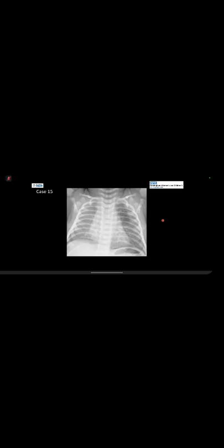Yeah, this frontal radiograph, a pediatric group patient, is a frontal chest radiograph. So there is hyperinflation over the left lung, and with hyperlucency over the left lung as well. So I think the abnormality lies in the left lung. The right lung relatively appears clear. There's no nodules or consolidation. There is widening of the left intercostal space also.